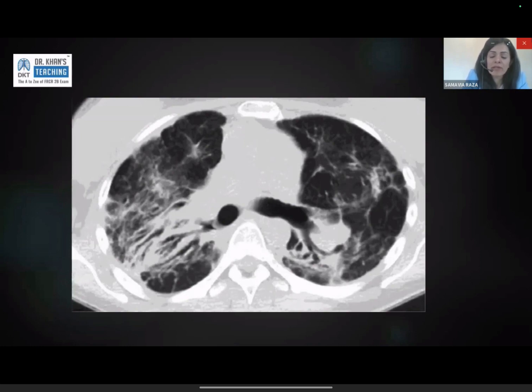And the way to remember it is, when you have a CT chest and it's a supine scan, what you want to look at is, when it's sarcoidosis, it's upper to mid zones, and it looks like somebody has taken the bronchi and pulled them back. Like if somebody was standing in front of you, facing the other way, and you took their arms and pulled them back, that's how it looks when you look at the lung. It looks like there's somebody pulling it back and laterally. So the bronchi are going to curve back and curve laterally.